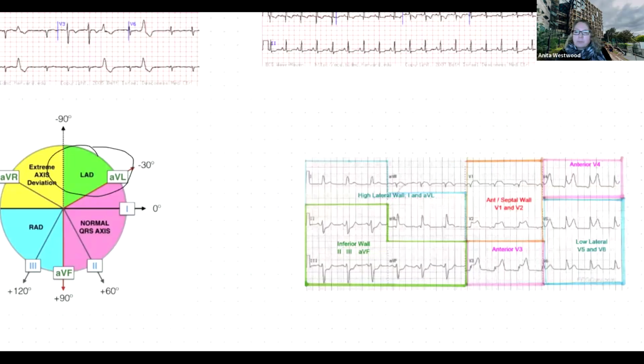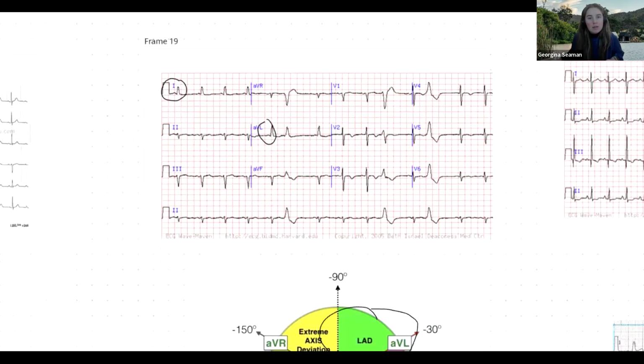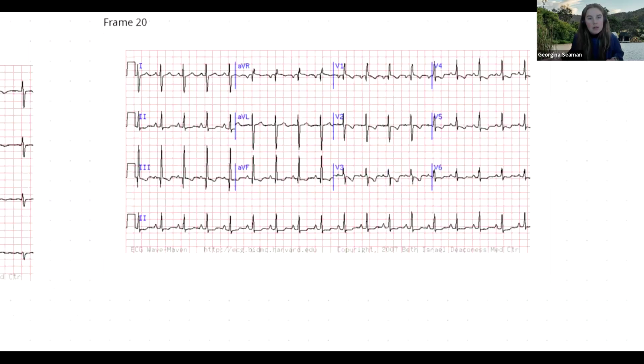Absolutely, Kate. And that's exactly why we went through our safe principles before this, because to that point, if you have your electrodes in the wrong spot, then you will see that. Everyone's got an axis deviation. Which is why we first check the electrodes, because we don't want to say, oh, you have left axis deviation, when actually you're perfectly fine, and you just put the electrodes in the wrong spot. Literally nothing more embarrassing. All right, let's go into this one, and then we'll start.